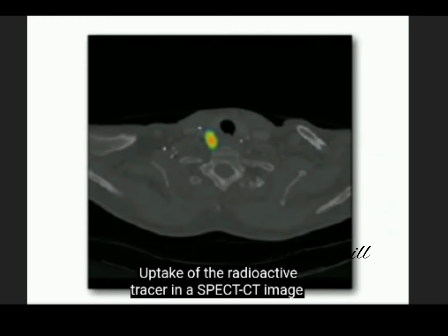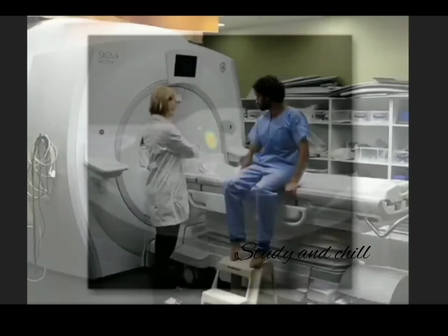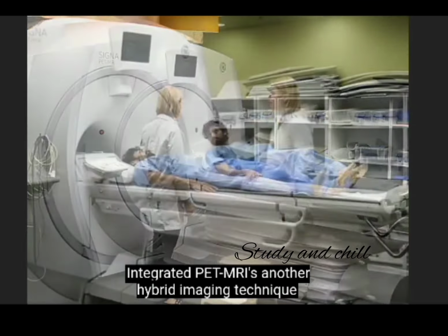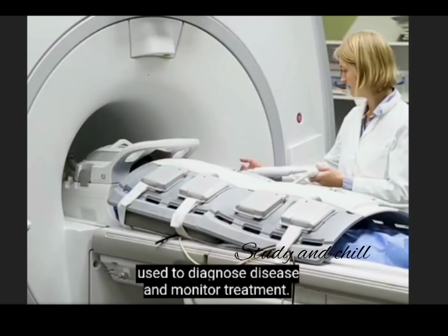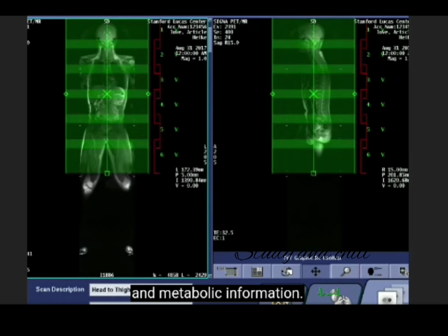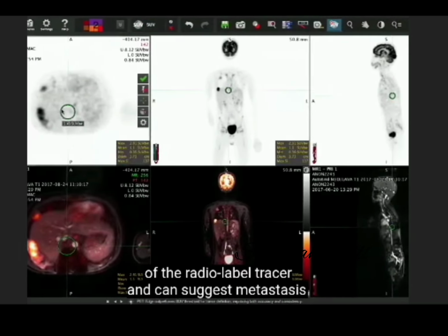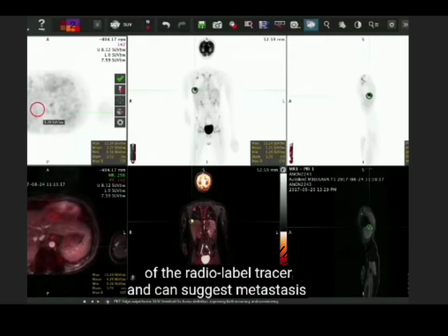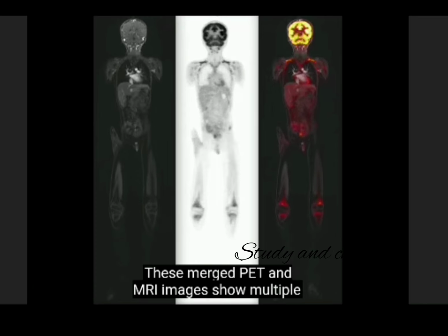Integrated PET MRI is another hybrid imaging technique used to diagnose disease and monitor treatment, because it provides both high contrast of soft tissues and metabolic information. Regions of high contrast indicate uptake of the radiolabel tracer and can suggest metastasis in cancer screening. These merged PET and MRI images show multiple hypermetabolic pulmonary metastases and a metastasis in the right ventricular outflow tract of the heart.